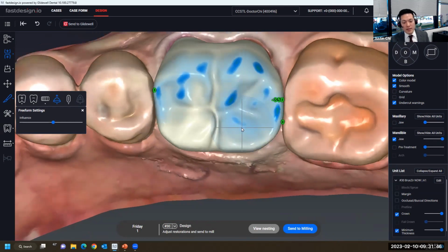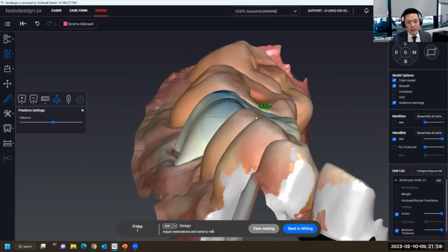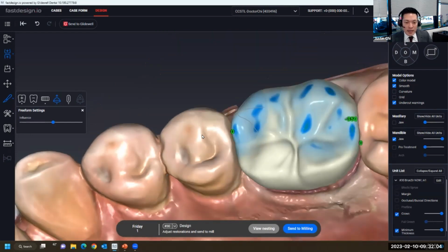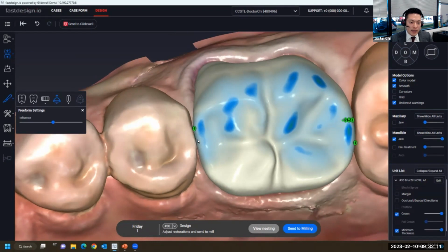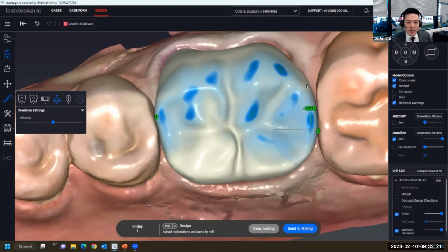So once our design, we've looked at the chewing efficiency, occlusal stability. You can make modifications if you need to there. The cusp-fossa relationship is great. The buccal cusp of our mandibular molar fits into the fossa of the opposing really nicely. That's wonderful. Now let's look at the broad contacts on the proximal surfaces. The initial placement of the contact, not bad, pretty centered with the adjacent teeth. And the broadness of the contact will be dependent on if you're next to a premolar or even an anterior tooth where it's going to be much smaller, or in this case, from the distal, we've got our second molar contact.